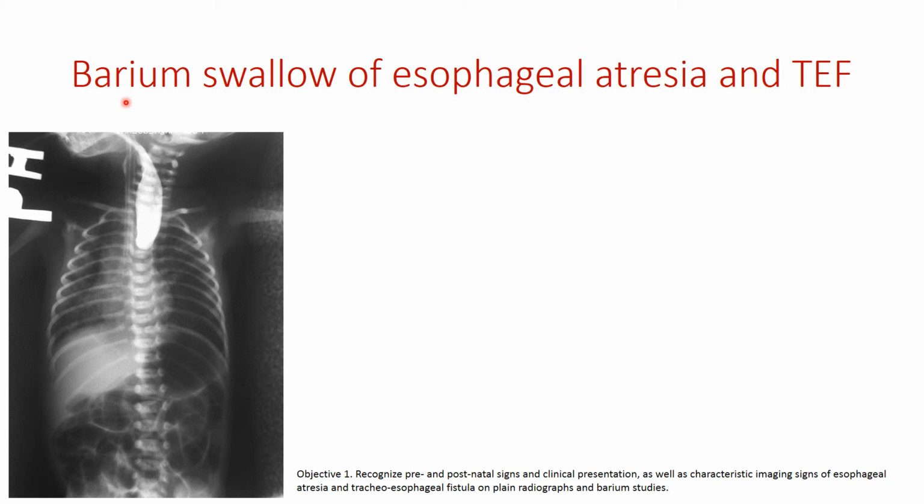But anyway, here's an example of a baby with, again, the esophageal atresia. So we have the esophagus. In this case, they have an endotracheal tube, so the baby won't aspirate. But here's the proximal esophagus. It doesn't pass beyond that. In fact, here's a little hemivertebra, or a spina bifida. Anyway, we can see a little slit in that vertebra.